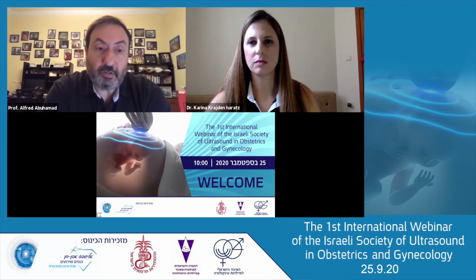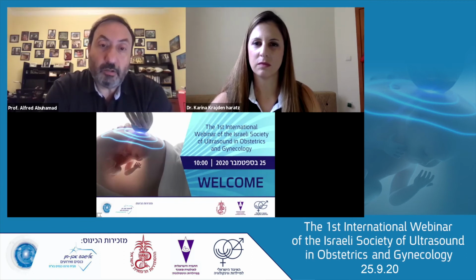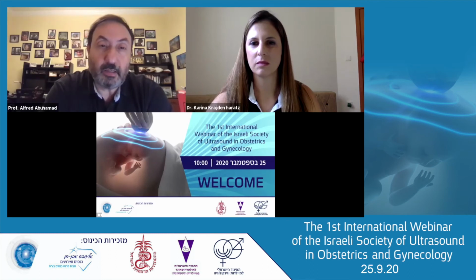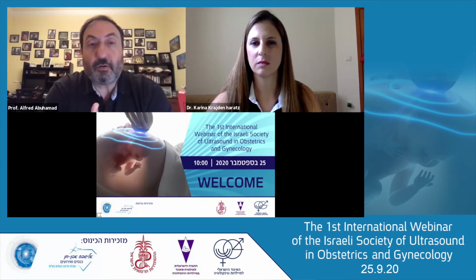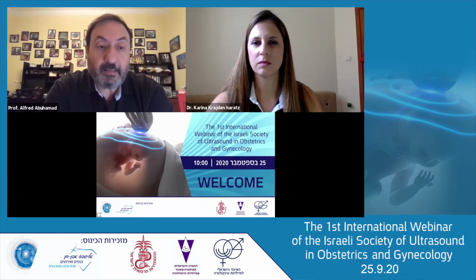in the first trimester. And what we recommend to do is doing a 4-chamber view with and without color, and a 3-vessel trachea view with color. And that the 4-chamber view, the importance is to make sure that the ventricles have equal inflows into them. So we're not dealing with the hypoplastic or AV septal defects. And we look at the cardiac axis, as I showed, because it is a very powerful screen for congenital heart disease in the first trimester.